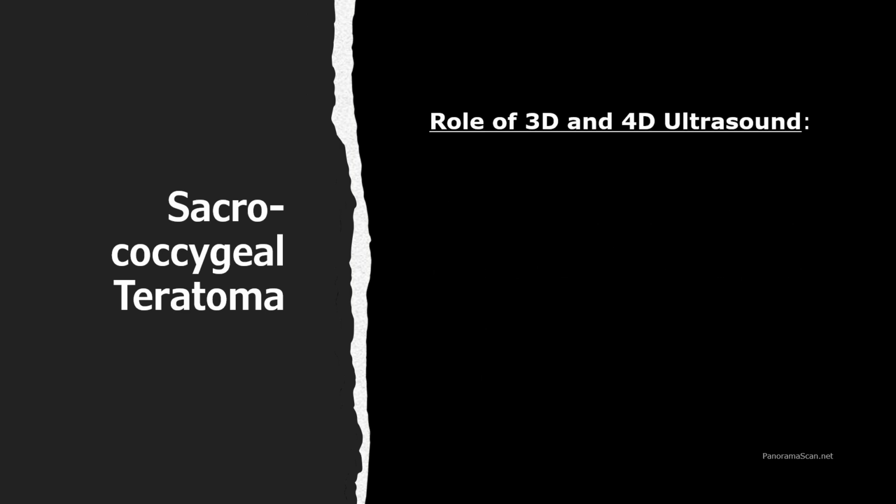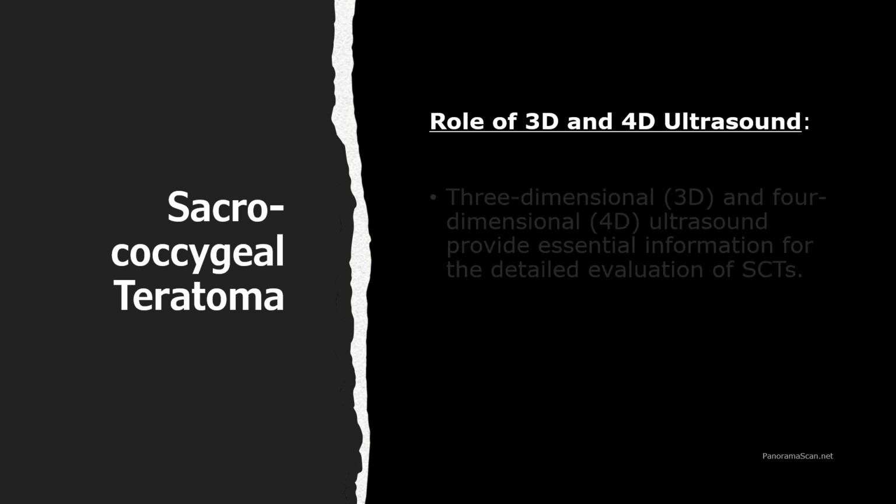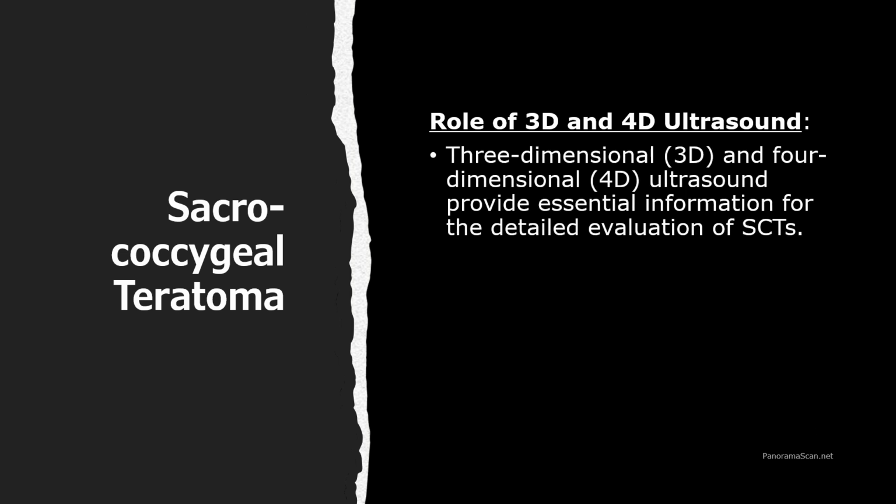3D and 4D ultrasound play a crucial role in the detailed evaluation of sacrococcygeal teratomas.